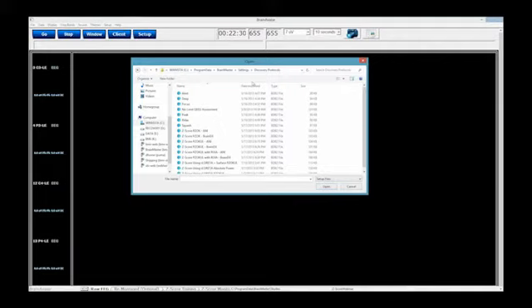Now, in the Discovery Protocols folders, you're going to notice we're going to start with these four right here. There are four protocols. One is ZScore PZOK or PZOK-ANI, ZScore PZOK-BrainDx, ZScore PZOK-UL ANI, and ZScore PZOK-UL BrainDx.